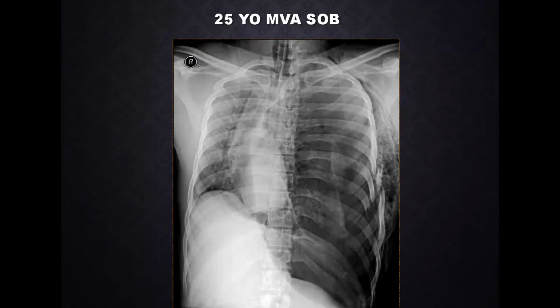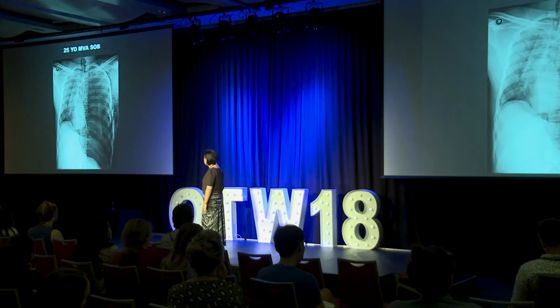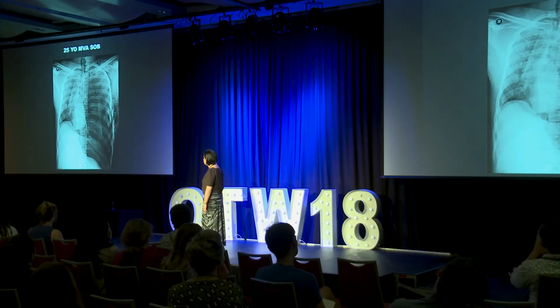So the patient is a trauma, so you'd probably see this in the ED. A patient came in with a high speed MVA. What do you see? Lots of abnormalities here. So a lot of gas in the subcutaneous tissue. So a lot of left subcutaneous emphysema. And there are all these rib fractures. Consecutive rib fractures, probably not a flail segment because it's only in one spot.